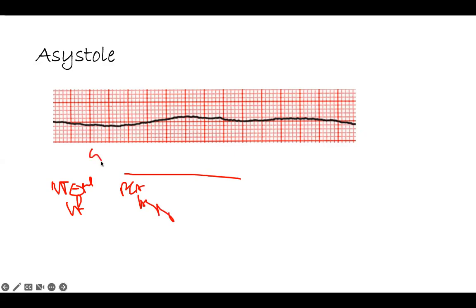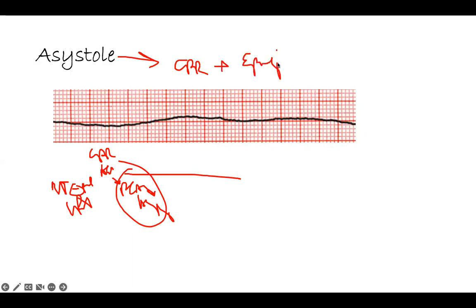First patient, you start CPR, you check, the AED is coming, and it tells you this. If it says PEA and asystole, you don't give them a shock. This is one of the non-shockable rhythms. You continue your CPR and give them epinephrine. So this is the management. Patient with asystole, continue CPR, give them epinephrine, and go through the ACLS cycle.